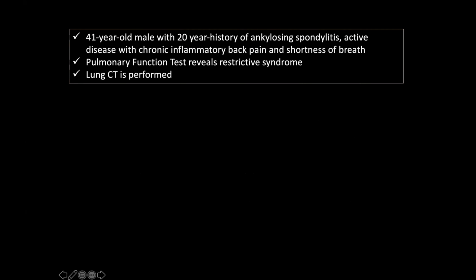Now, this patient is a 41-year-old male. He has a 20-year history of ankylosing spondylitis. Patient has active disease with chronic inflammatory back pain and shortness of breath. There was a restrictive syndrome that was diagnosed on pulmonary function test, and a lung CT is performed.